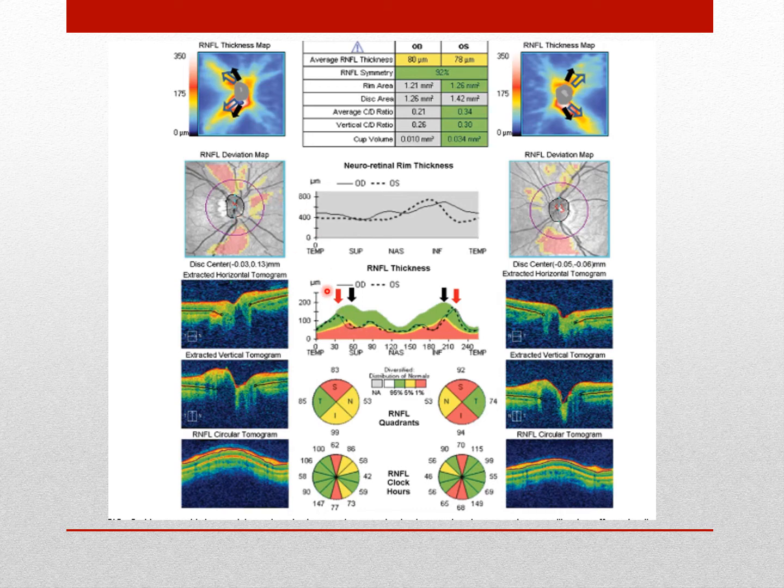So this just shows you that temporal shift. So you see here, this is where the actual arcuate bundle is in the superior temporal area, and that's why you're seeing it in the green area here for the right eye. Whereas here the black area is showing the general population. Usually it should be in that area, right, to follow that double hump. And the same is true for the left eye, showing that temporal shift. And everything here is just being translated in the rest of the graphs.